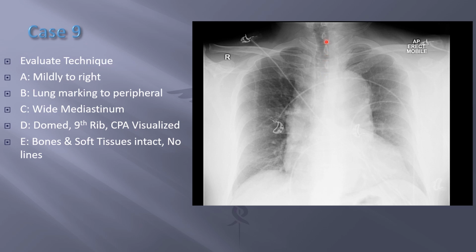But that might mean that the trachea is kind of deviated a little bit over to the right. So maybe a little bit underpenetrated, because you can see it's kind of really washed out on the periphery here. So maybe a little underpenetrated. So we have to take that into account, not to under or over read something. Trachea is mildly to the right.